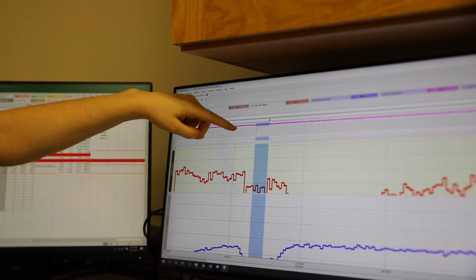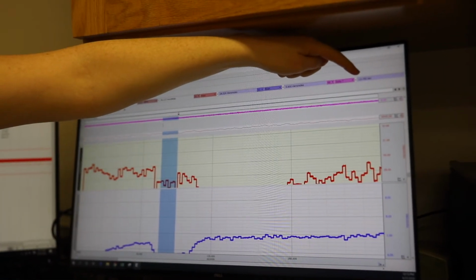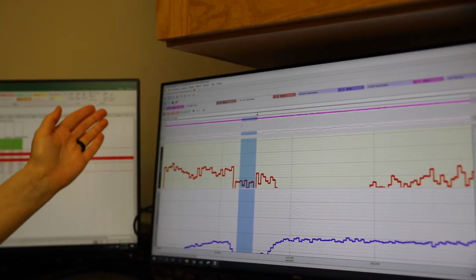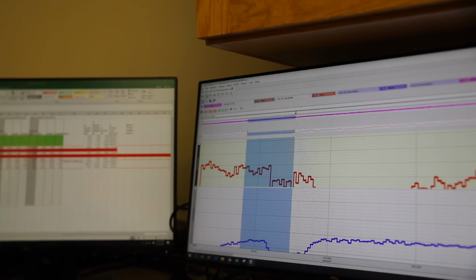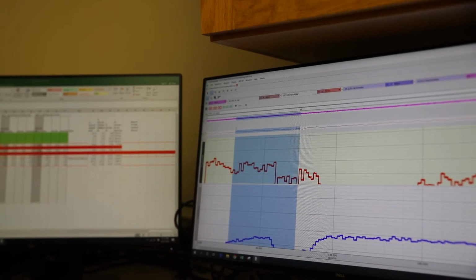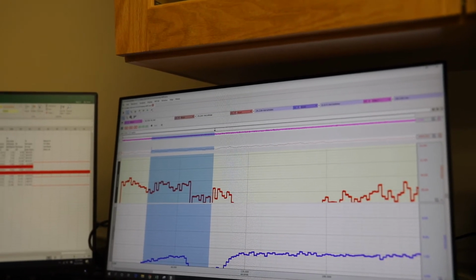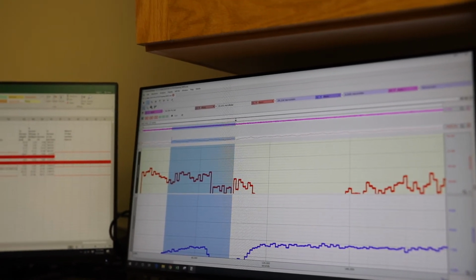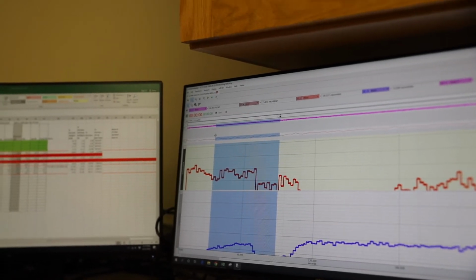And then we're going to go for 60 seconds backwards. To know when you've hit 60 seconds, you want to be looking at this number, and it should show a minus 60 because we're going backwards. So we're about 59 seconds right now. It's not going to get to 60 seconds even, so just try to get as close as possible.